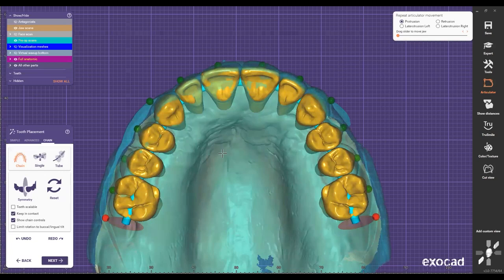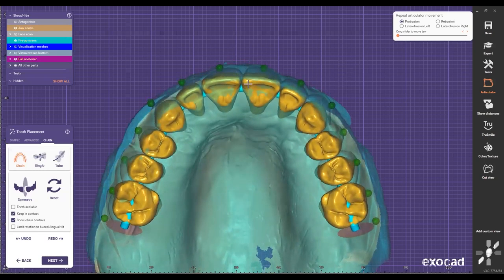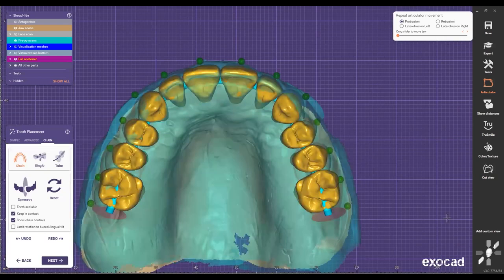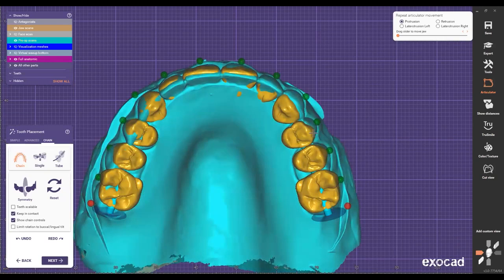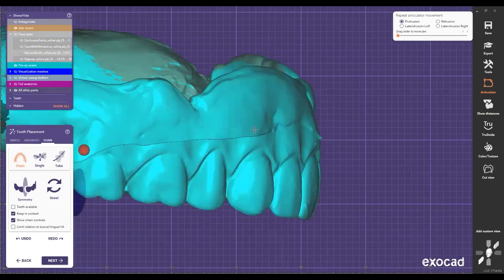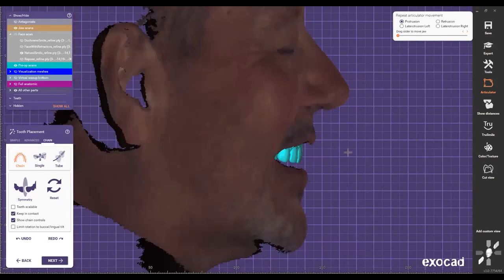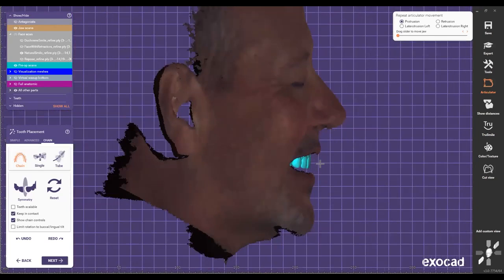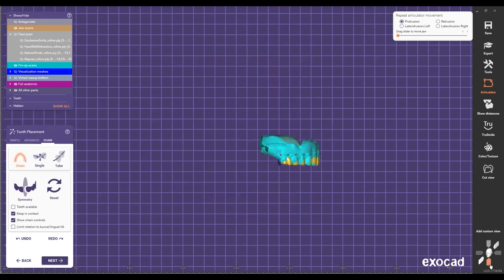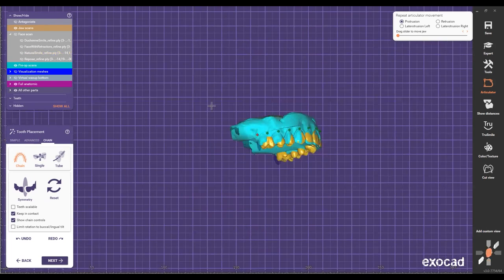Right now I'm following the denture, but I also need to see where the midline is going to be, right? And we said that we're going to have the same right here up to there. I need to see if these teeth are in the proper profile, the angle of these teeth, based on the face. I said, okay, I think that these teeth are pretty much good. Maybe a little bit of incisal edge coming out, but I like them, right? So I'm just going to follow everything there.